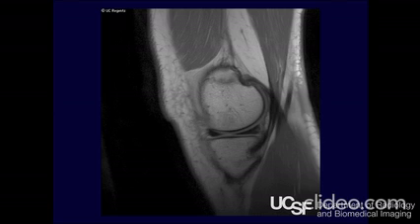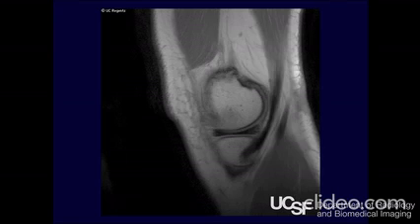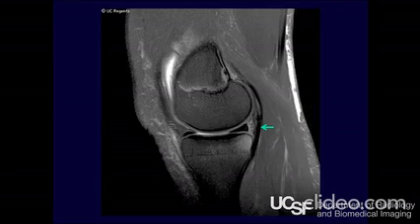What do we see on the posterior part of this medial meniscus? It should be dark. It should not have a high signal going down vertically in the back there. It's not in the meniscus. It's right at the meniscocapsular junction. But if we look at our fat sat sagittal, we see it. That should not be there. It should never have high signal right behind it. So that is a meniscocapsular separation.